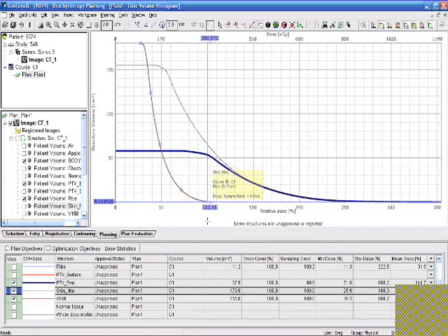The Contura registry has requested that you try to keep the maximum dose to the skin below 125%. My personal bias is that that's not ambitious enough, that with good planning tools like this and with a good applicator like the Contura, you should be able to get close to 100% in almost all of your cases. So you should strive for that if all the other parameters can be met. And you saw that our V150 looked good here.